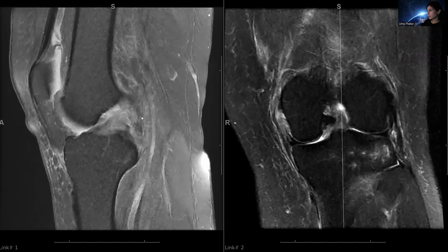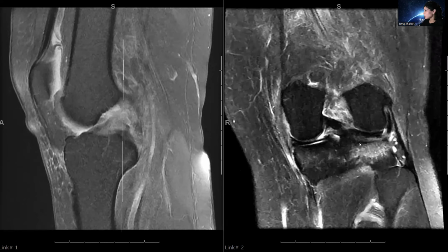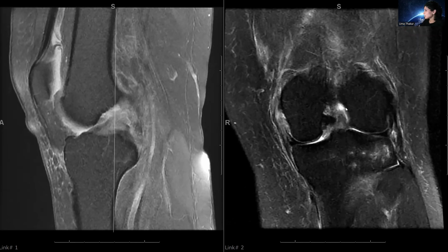In this case, this is a 47-year-old man who had sustained an injury, and you can see that this ACL is diffusely edematous, and you don't have that normal striated appearance. And right here, it looks like there's a high-grade tear. But this is a case, I think, in which the coronal plane really helps. How you're normally supposed to see this whole aspect of the lateral notch covered with ACL fibers, it's completely absent here. And you can see much better on this coronal that there's fluid signal intensity and a near complete tear. So the arthroscopy report was near complete tear, and I think it's because there were maybe some few intact residual fibers here laterally and distally. But knowing that this should be covered really helps you in this case.